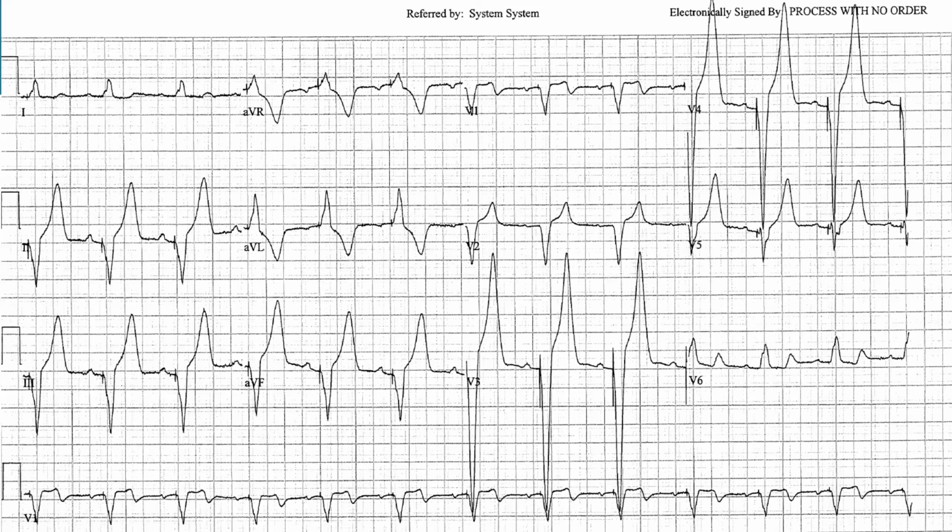And here's a clear case of ventricular pacing, right? You see the pacing artifact across all leads in the context of sinus rhythm. This is not this patient, incidentally. But somebody with sinus rhythm, first degree AV block, or higher grade AV block in whom there's consistent ventricular pacing all the time. And you see how you have negative QRS complexes in 2, 3, and AVF. And if you take a look across the precordium, you see evidence of a pretty clear left bundle pattern, meaning completely negative QRS complex in V1, completely positive QRS complex in V6.